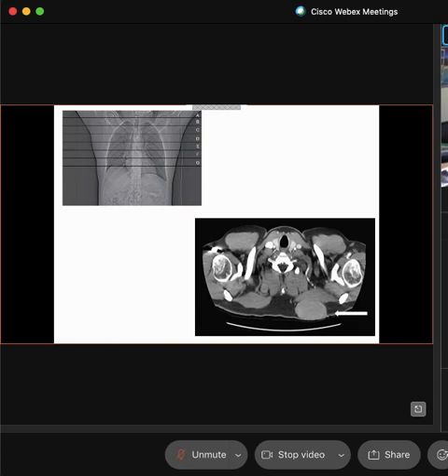So, what does this mean? As you start to prepare, and we'll go over some more images, you'll need to look at what you can see or what you can't see versus what this is. You can see round and white. What does bright mean, Asias, on a radiograph?